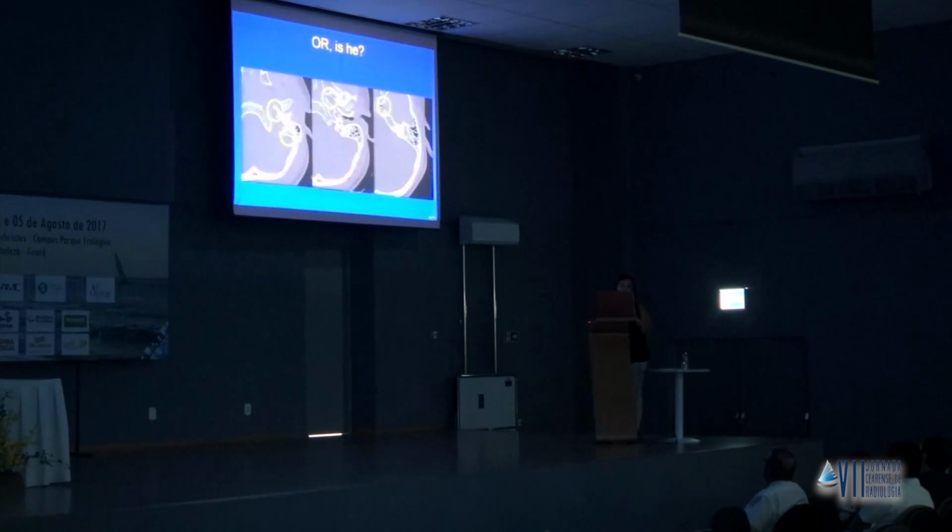But think about it a little bit more. Is he really lucky? Another important complication in these patients is, so let's see what we find out, and then we will find the answer. If you see a temporal bone fracture, pay attention to the areas where the important arteries and veins go through.